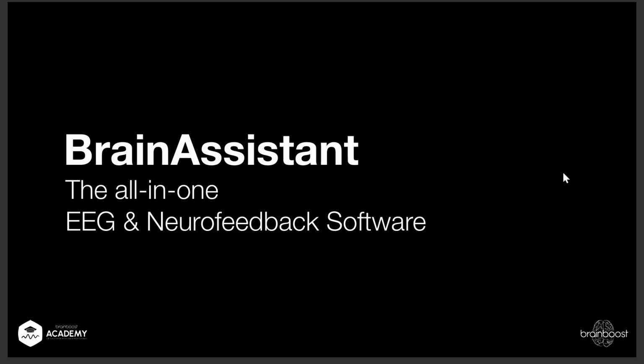In this webinar, we will show you how you can now customize your protocols even more. For example, you can build your own ratio, like theta-beta ratio, but you can also build a ratio with custom frequency bands. Also, we will show you how you can customize cognitive tests. For example, the CPT test, you can now decide how many figures you want to show, how long they should be shown. So you can now individualize a lot of things in the BrainAssistant and tests. Have fun using them. Let's get started.